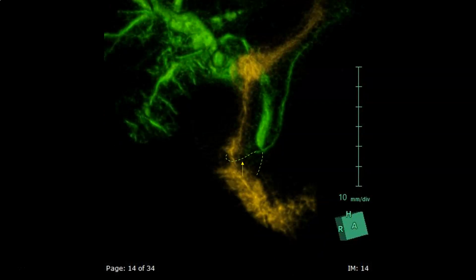And this is the situation as we complete it from what we have seen in the sectional images, because the MRCP has been of poor quality in this case. So the very thin fluid containing structures like the pancreatic duct to the annular pancreas here and the lowermost part of the common bile duct here are not fully depicted on this MRCP.